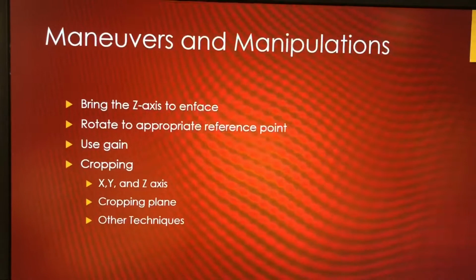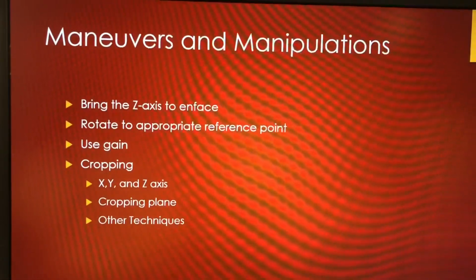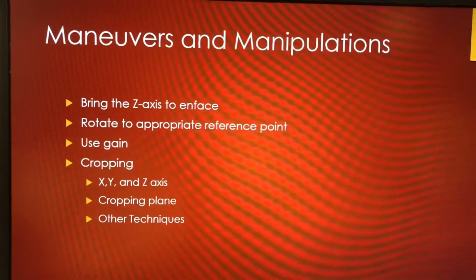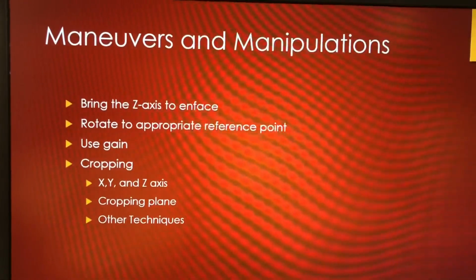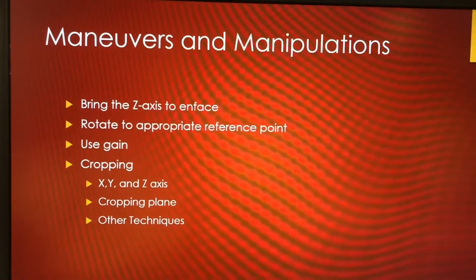And then we have other techniques, like true view, that helps us see different structures and outlines, sometimes a lot easier than we would with just a traditional 3D blue and yellow type view.